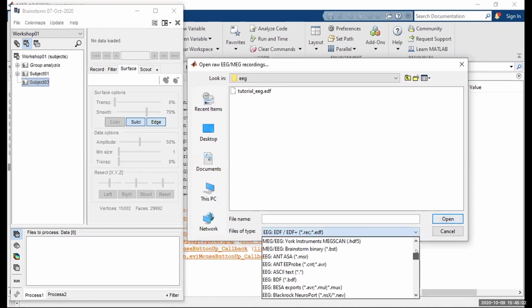But just for your information, we have a huge amount of existing file formats already supported, so that you can import your raw file into the software, such that we're pretty confident that for most of you, right away you'll be able to import your data, because most commonly used formats are already supported. And if you find that, sadly, your specific format is not supported yet, just please write to us on the forum, and we'll be happy to work with you or work with the vendor in order to add support to it, because we know this is how we can spread the tool and make it as popular as possible if it supports every possible format.